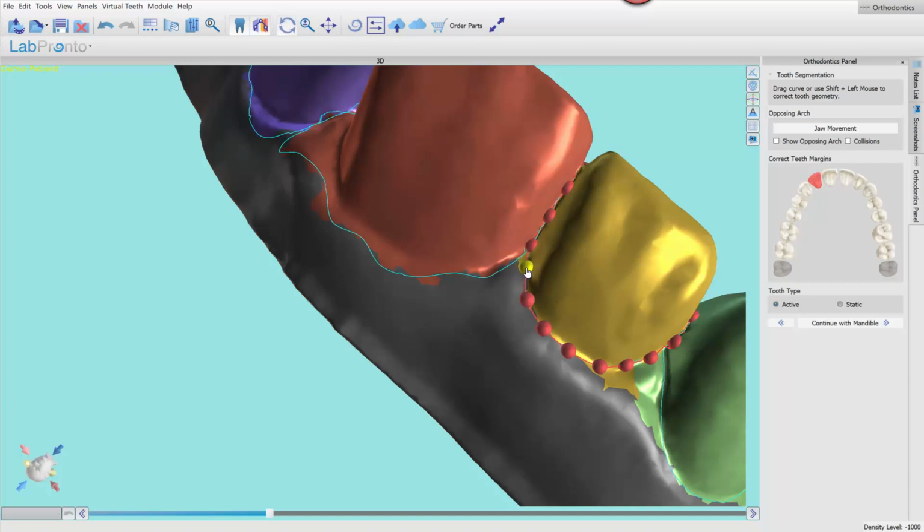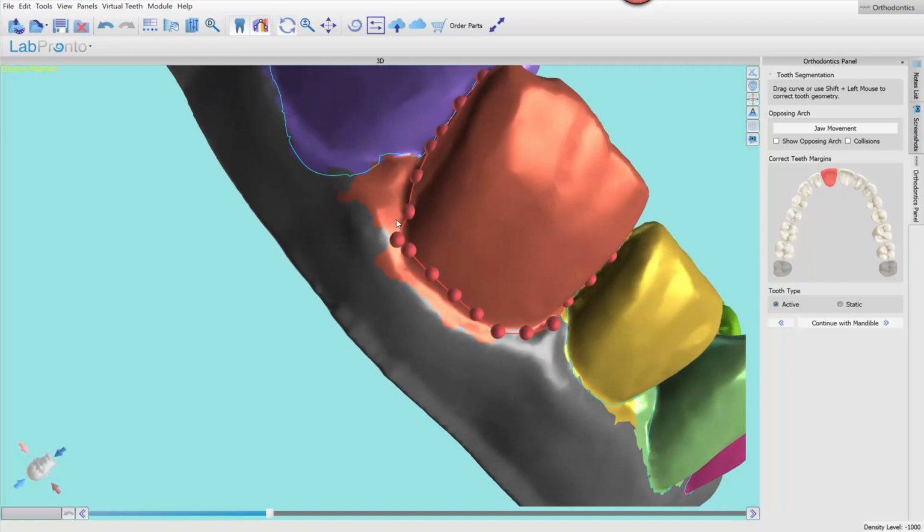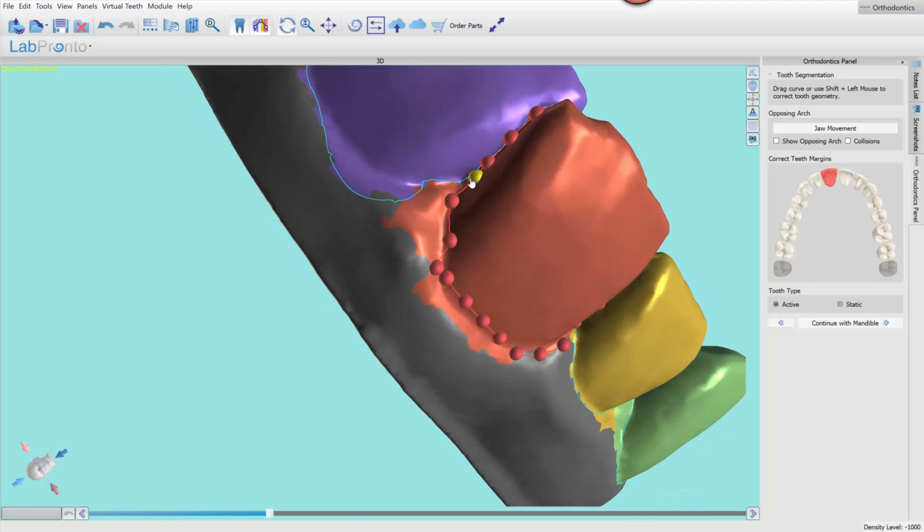This is a very young patient, hence the short clinical crowns. She's a teenager, and so her teeth will continue to erupt with time, or I should say, the tissue will retract a bit, whichever combination of the two. But all right.